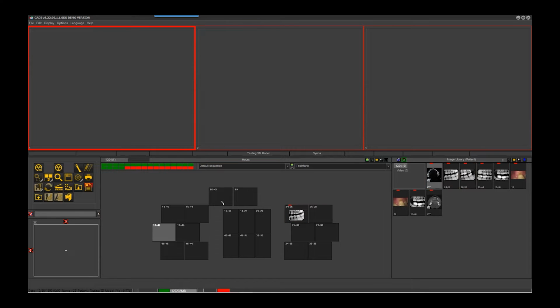So then, let's say like the sensor, well, actually I'll just wait until you're done and then I'll ask questions. Keep going. No, that's okay. We'll get through the 3D part. Do you have any questions about how the 3D module would interact with your current imaging software? I do not. I think that this has already been answered.